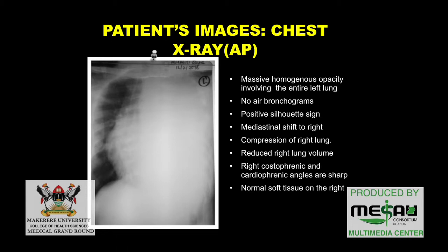And the costophrenic and cardiophrenic angles are sharp for the right lung, which we cannot make out on the left side.